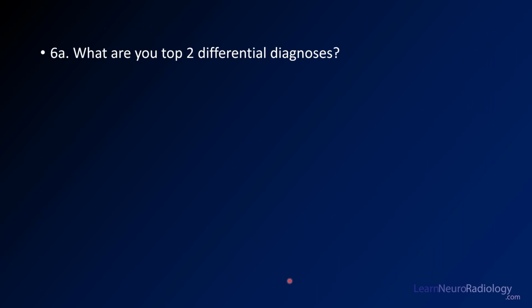I've been a little bit nice here. Your question is what's your top 2 differential considerations? So you don't have to come up with one necessarily. Hopefully on your exam, if you have a multiple choice situation, you're only going to see one of your top 2, so that would be nice.